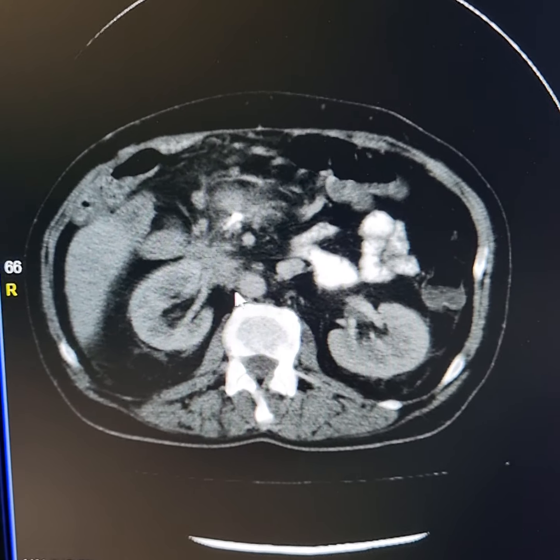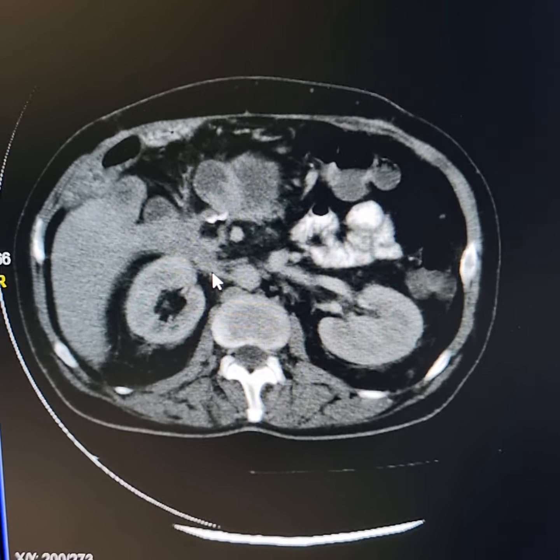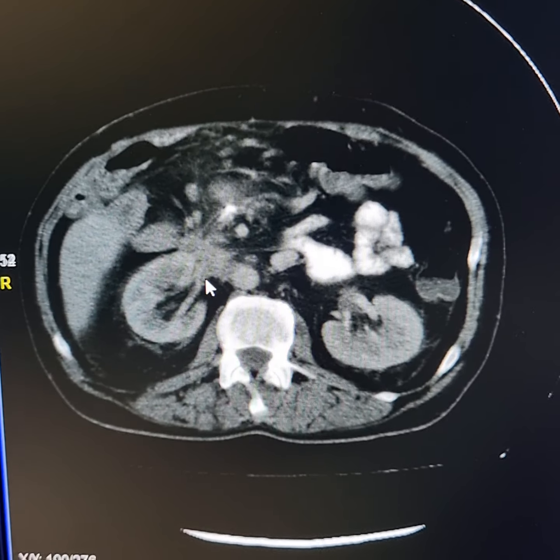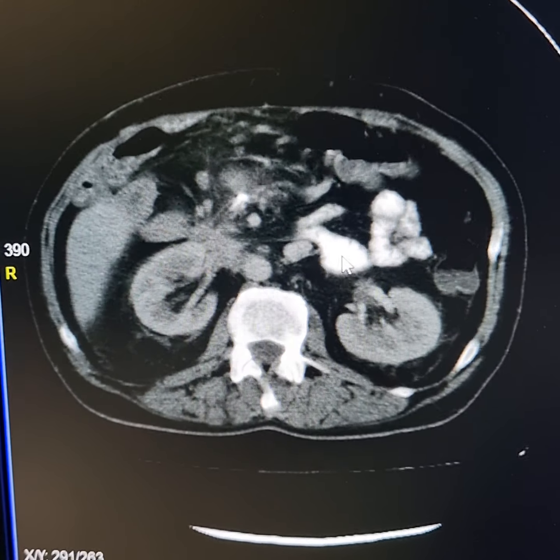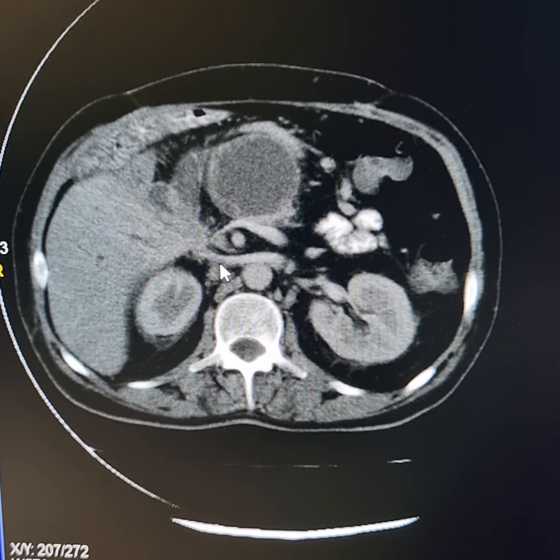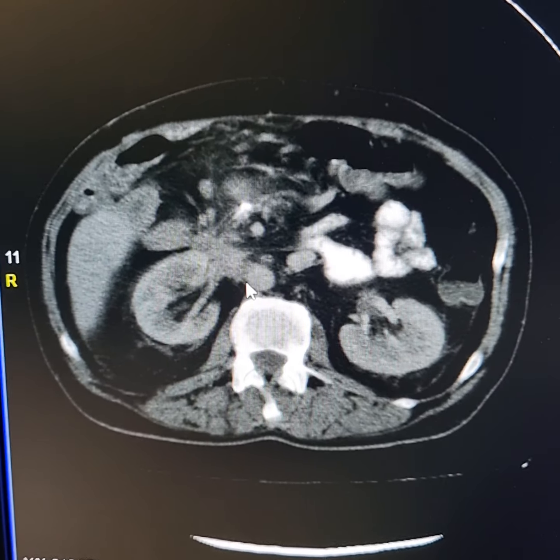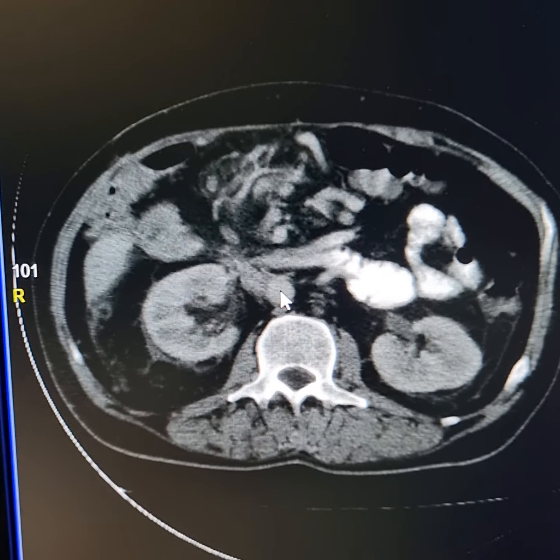Now this is the aorta. The mass has surrounded the right renal vein. Its lumen is severely narrowed. The mass has also surrounded the right renal artery, and the medial part of the left renal vein as well. Its lumen is also severely narrowed. Now I trace this mass down. The mass lies in contact with the aorta with indistinct interface.